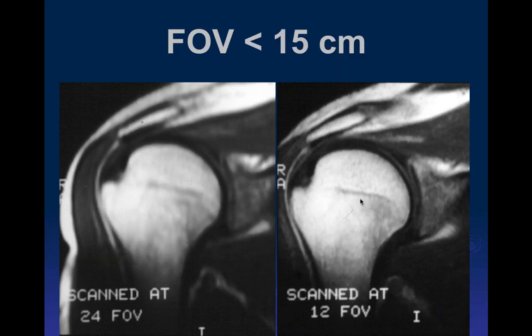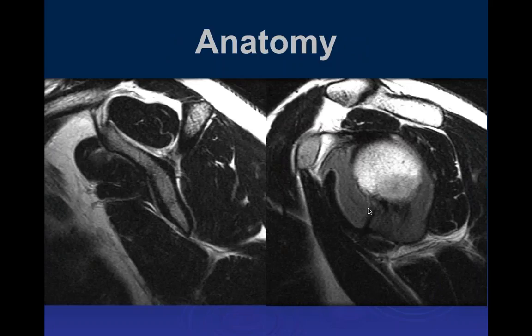Consequently, when we go to low field, I still think you have to have the resolution, but I just compromise signal to noise. So at low field, I look at grainier images at the shoulder. A lot of people, when they go to low field, increase the field of view and decrease the resolution, so you have an image that looks pretty, but you don't have the resolution to make a diagnosis. So a lot of people will criticize mine because they're grainy, but you have to have the resolution, because there are a lot of studies in the old literature showing that without the resolution, you're not going to be able to make diagnoses. And the signal to noise turns out to be less important than the actual resolution, in my opinion.